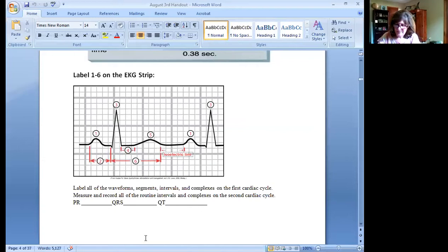And it would be nice if you took this piece of paper and I'm gonna draw this for you right now. I'm gonna try to demonstrate this for you. Next time I'm gonna be prepared with an easel. Everybody see that complex? Let me show you how I'm gonna mark from the beginning of the P wave to the beginning of the QRS with my little piece of paper.